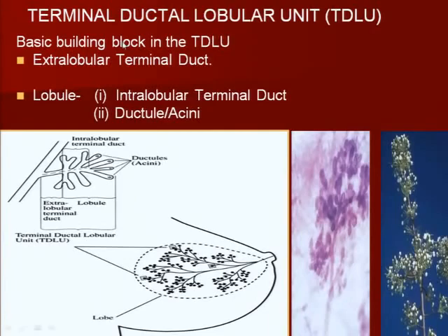Why is terminal ductal lobular unit so important? Why do I go about talking about TDLUs? TDLUs are very important because they are the areas where most of your breast cancers arise, most of your breast diseases arise. So you must know what these TDLUs are. They're actually little nodules that you see on X-ray almost every other day.